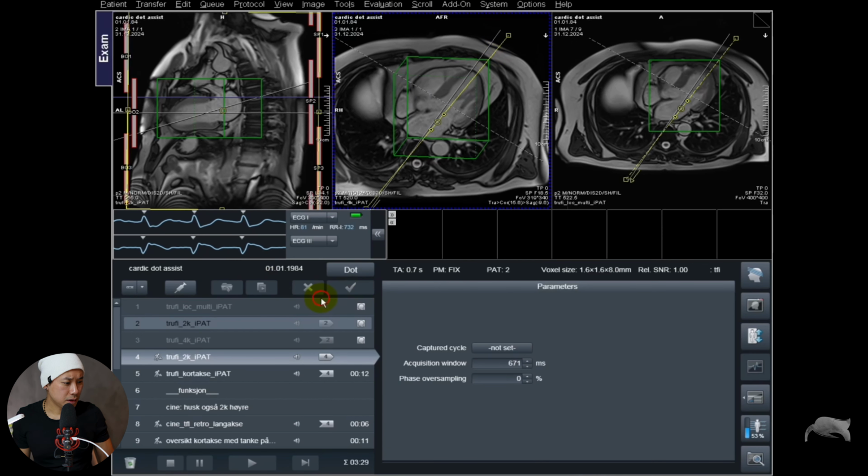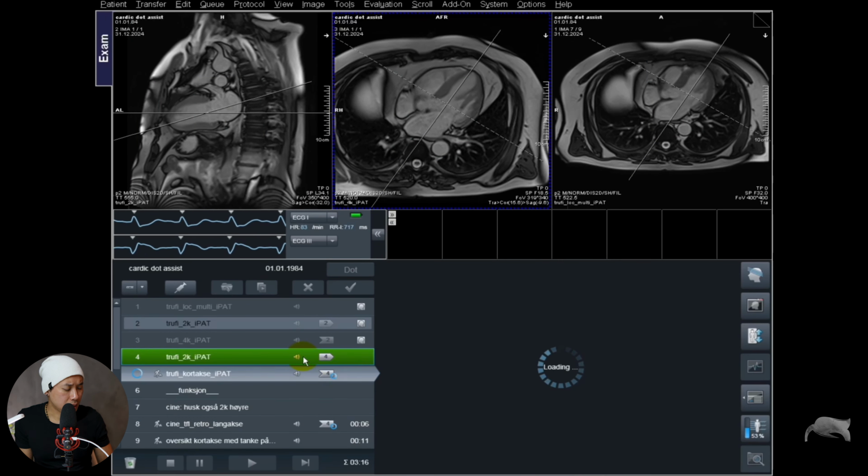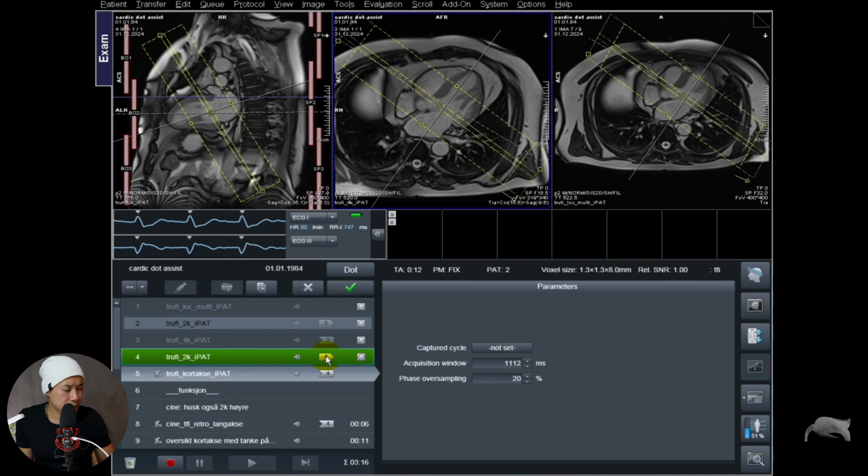And you can see now it's not 2 anymore. The number 2 is now broken, so we are now at number 4. So this is the master, and all the slaves below are copying to number 4, just because we did the repeat and open. And everything below will be copied, as you see.